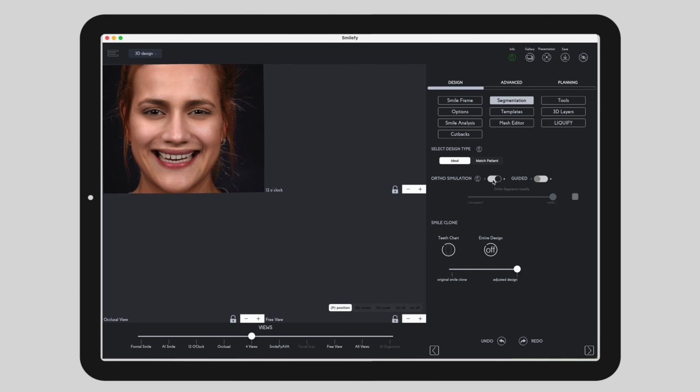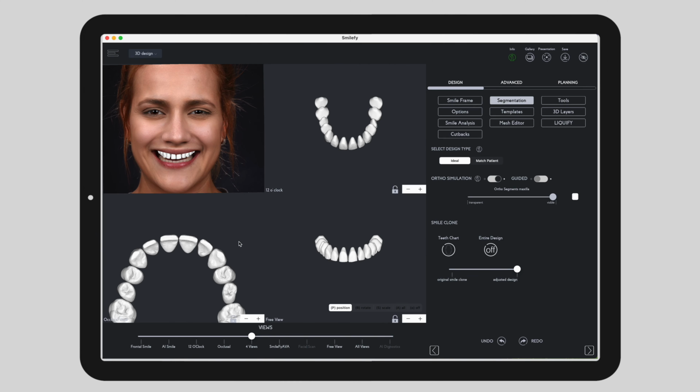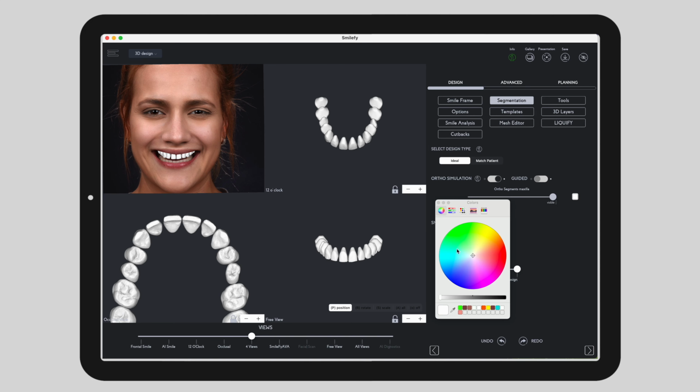Prepare the orthodontic plan. Before modifying the aesthetic elements of the smile design, it is essential to establish a proper orthodontic foundation. This ensures that any future restorative work, especially veneers, can be performed minimally invasively.